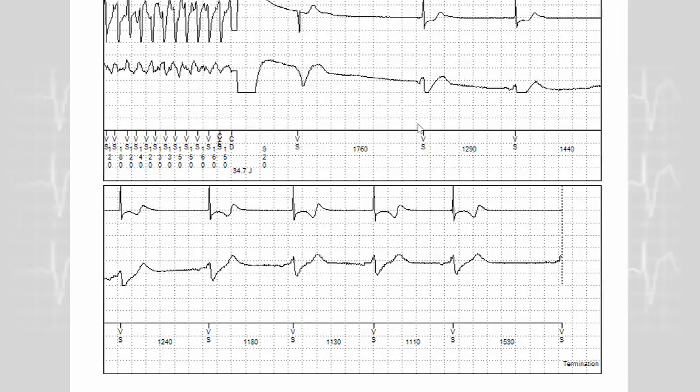So this tracing highlights the interest of a probabilistic counter in the VF zone. This is the case in Medtronic devices. We have seen in the 2 last examples that you cannot require consecutive cycles in the VF zone because, like in this example, some cycles, even well detected, can be outside the VF zone, or like in the previous example, you can see sometimes undersensing during ventricular fibrillation.